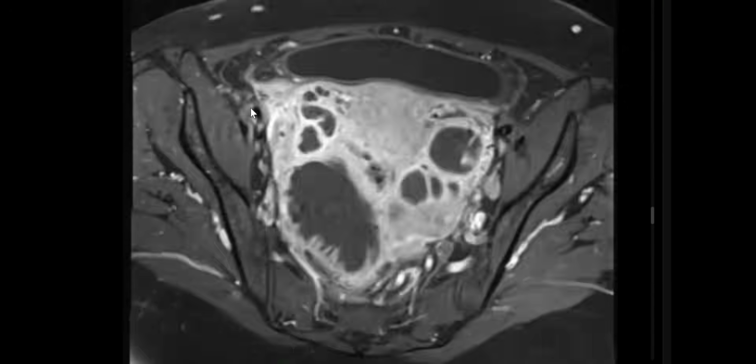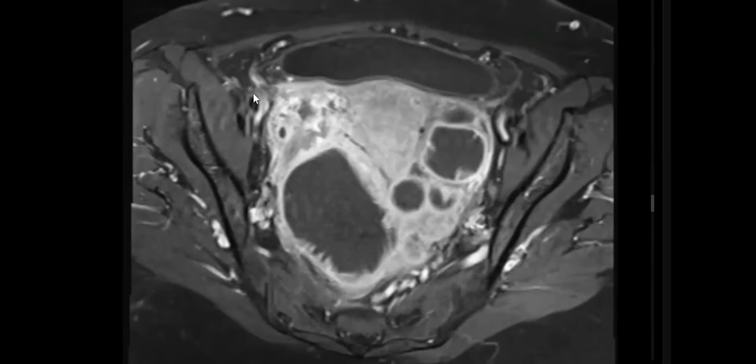In case of abnormal enhancement along the right paracolic gutter, in such cases it's very important to go up to the liver and gallbladder fossa for the possibility of perihepatitis, or Fitz-Hugh-Curtis syndrome. Usually in Fitz-Hugh-Curtis syndrome or perihepatitis, the abscess will be along the right paracolic gutter or even subhepatic in location. But this is for practice, not for the exam. Perihepatitis is difficult to be presented in the exam. It's for practice.